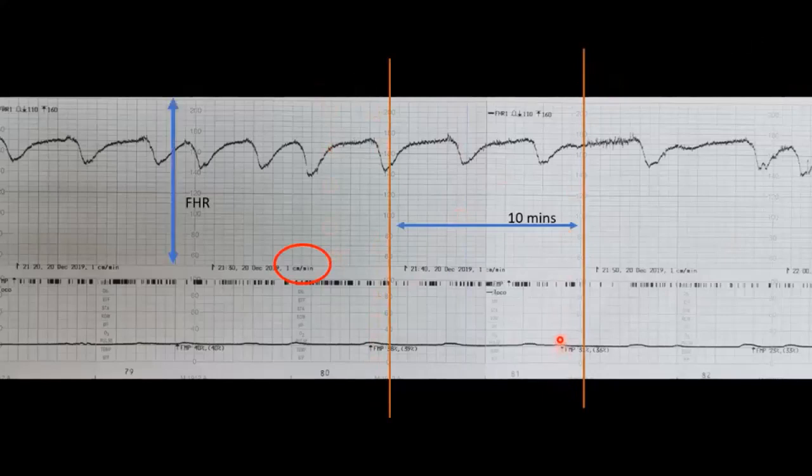Okay, and if you look into the vertical chart, so the vertical part is the fetal heart rate activity, then you can see the numbers. So it's as low as 40 to 220. Outside of it, it can show on the CTG machine, but you cannot trace it properly.